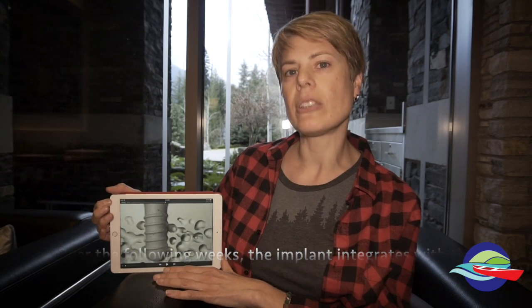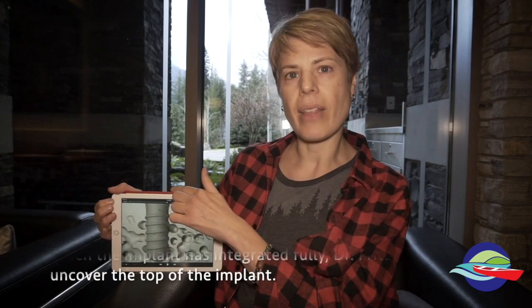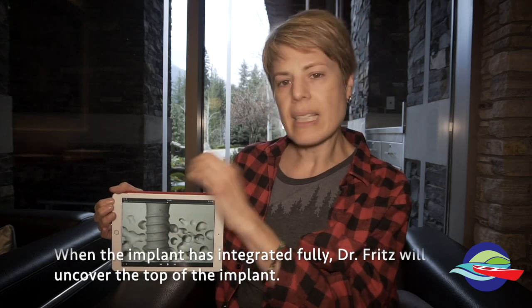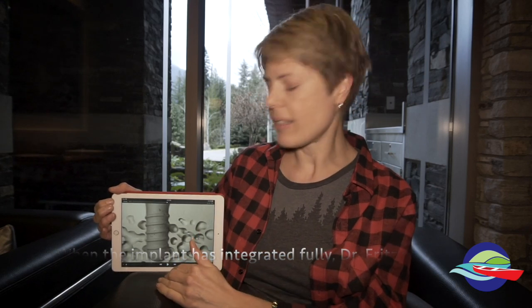And I explained to the patient that this time varies depending on the quality of the bone, so how soft or firm the bone is, if we have to add any bone to the area to reinforce that. So that can allow the time to vary. But what will happen at the end of, let's say it's 10 weeks, Dr. Fritz will uncover the very top of that dental implant. So that little area where we've sealed things off, he will actually make a little opening, remove the little lid that we had on there, and test the implant to ensure that it's integrated.